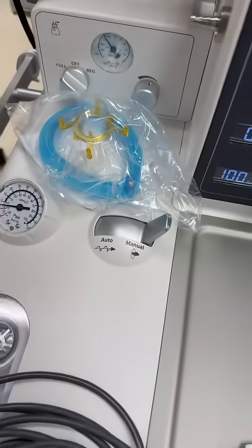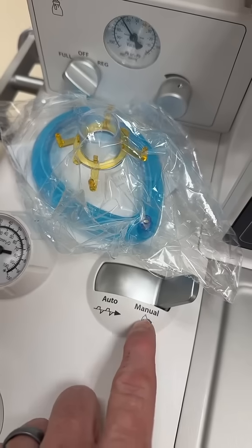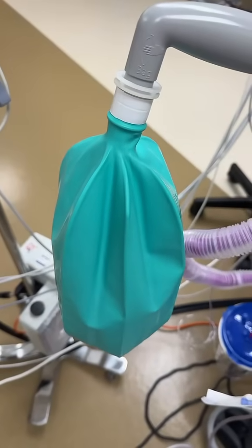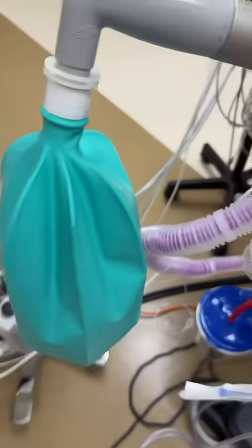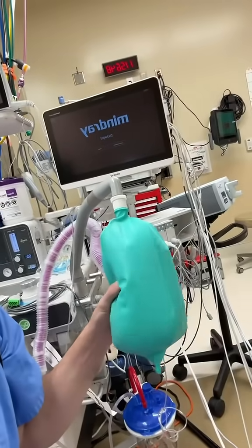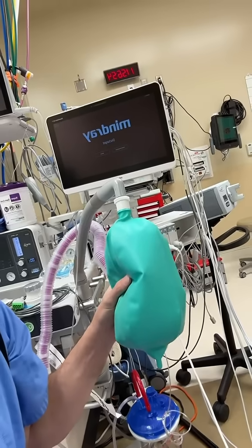The time when you're under general anesthesia, the ventilator will be breathing for you, and that's under auto mode. But if we want to, we can flip it over to manual, and that turns on this green bag where we control your breathing by how often we squeeze it. And this little thing here is called an APL valve. This controls how much pressure is in the circuit when we do that breathing for you. By the time that surgery is over, we have gotten most of the sevoflurane out of your body. That's the stuff that this vaporizer puts out. And we will switch this bag into manual mode, and we will squeeze it and help you as you begin breathing on your own until you can fully take over your own ventilation.